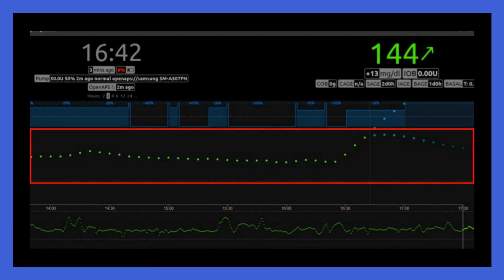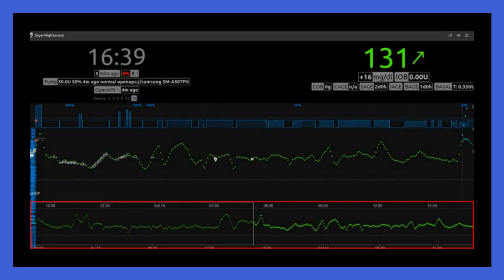The Sensor Glucose and Treatment section displays your sensor glucose readings, carbohydrate and/or insulin treatments, as well as predictions from DIY Loop. This Data History section shows the last 48 hours of data.